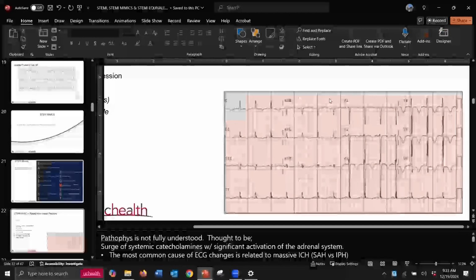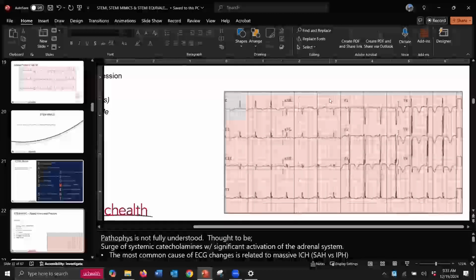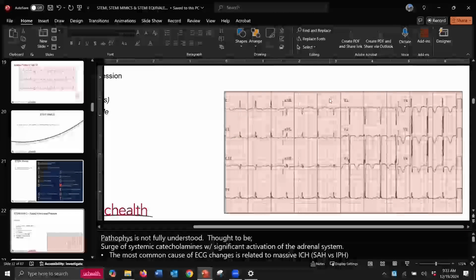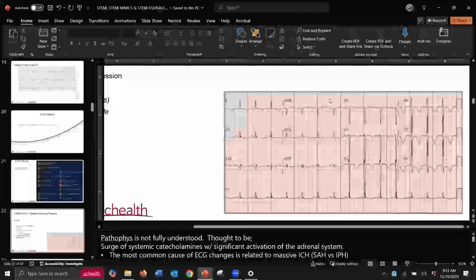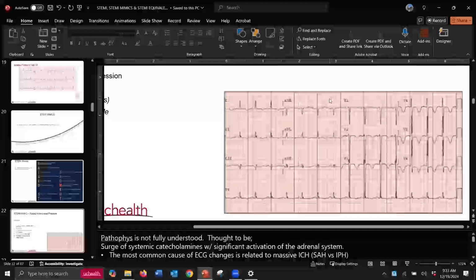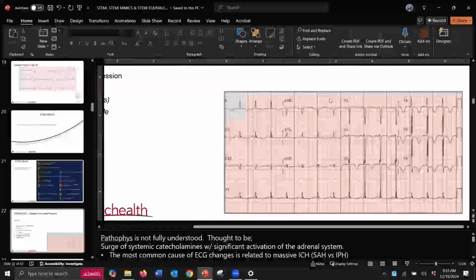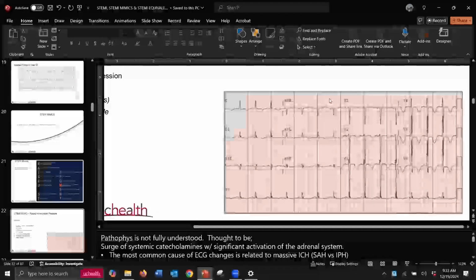The differential between a cerebral T wave and a Wellens T wave, or type B Wellens, is that the cerebral T waves are much more broad. If we take just V2 and look at that T wave, we can see that it is way broad. It actually gives us a prolonged QT, right? Our QT interval is greater than 50%, which is the 3 a.m. rule, not the whole calculated thing. It's 3 a.m. You just peed on a dumpster. It's Miller time. You're looking at this and it's greater than 50%. That's prolonged QT.